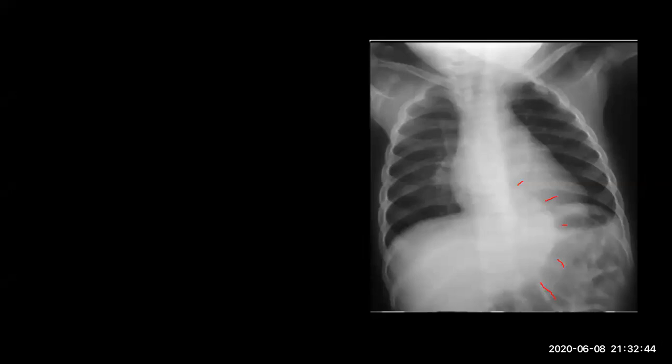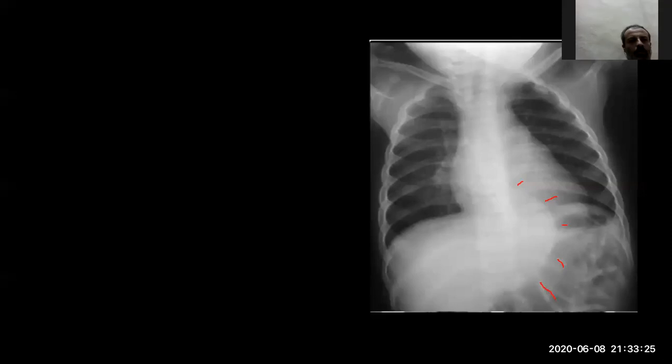Anyone who can describe? Okay, Muhammad Musa, you can. Muhammad Musa, raise your hand if you want to answer. Anyone? So this is a mass lesion. Where is that mass lesion located? I will help you. It is retrocardiac. You see the mass extending through the diaphragm, okay?